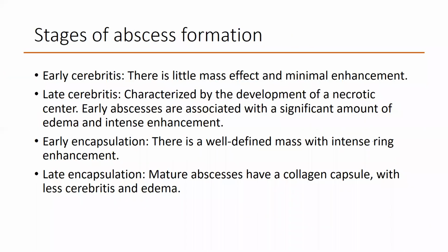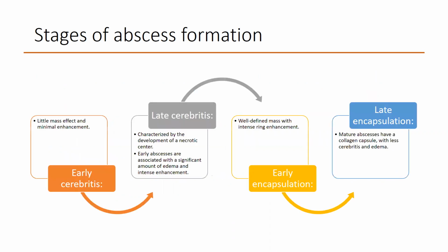For the first stage, early cerebritis, I have not put an image here. There will be little mass effect and minimal enhancement. You need to have a high index of suspicion to pick up an early cerebritis. This goes on, and the lesion develops a central necrotic center and a significant amount of edema and significant enhancement, and then the capsule formation sets in.